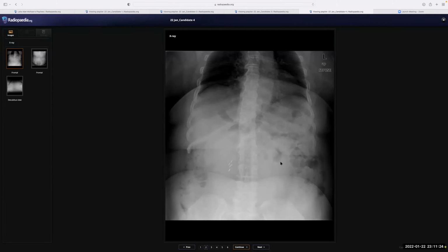but looking at the other part of the abdomen, I can see that the central part of the abdomen is not showing any significant bowel loops. So it appears as if there is a mass lesion in the central abdomen, which is displacing the bowel loops peripherally. The bones appear normal. I'm not able to see any lytic lesion in the bones. Given the prior history of RCC in this patient, I cannot see any pneumoperitoneum. I'm not able to grab anything more from this film.